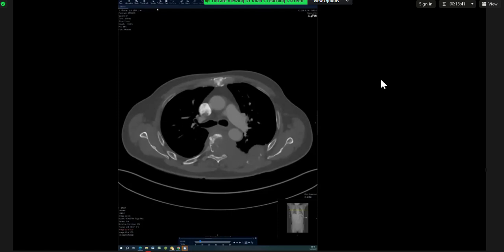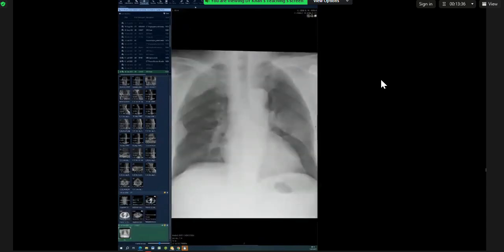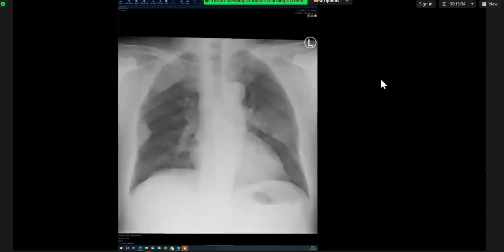I think you got everything right. The description I wanted straight away was multiple bony lesions, because I think in this one it's quite obvious the bone is missing here, and that's why they look so clean. That's why you pick them straight away, because there's no bone behind it. If this was the only abnormality, I would describe the pleural-based obtuse margin, etc. But here the bone destruction is quite clear. So I was looking for bilateral aggressive lesions causing bone destruction. I'm concerned for underlying malignancy, metastatic or primary bone.